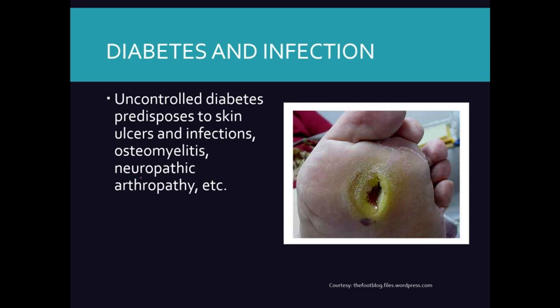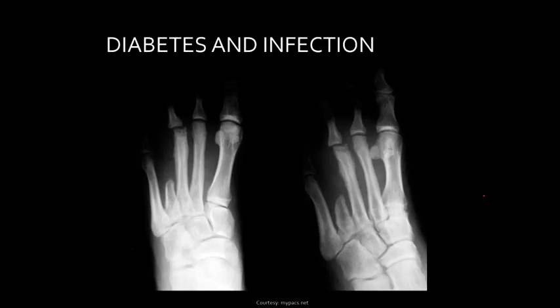This is something you'll talk about next semester. So here we have that ulceration, likely is infecting the tissues deeper as well. So in this patient here, we can see that they've had a resection of their fourth metatarsal, likely because they had some issues with it in the past and they had to take it out. And now additional changes are continuing on in the third metatarsal. So we're getting more sclerosis, periosteal reaction, that joint space doesn't look so great. So a combination of both septic arthritis as well as infection in the bone.